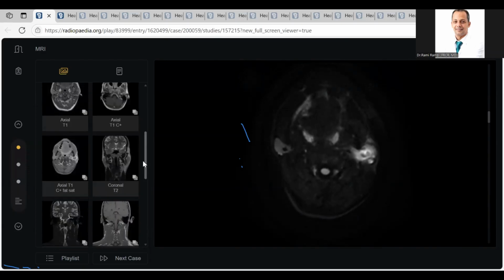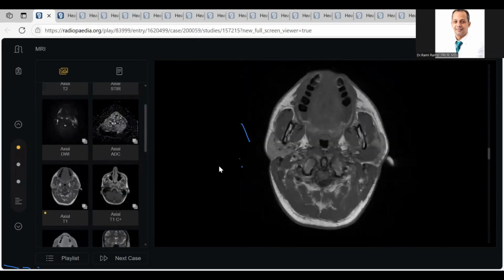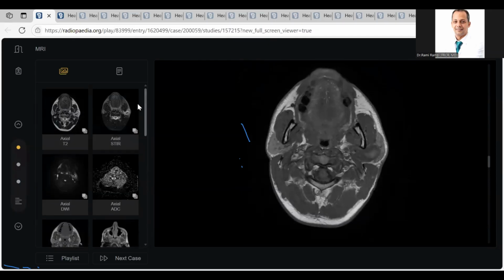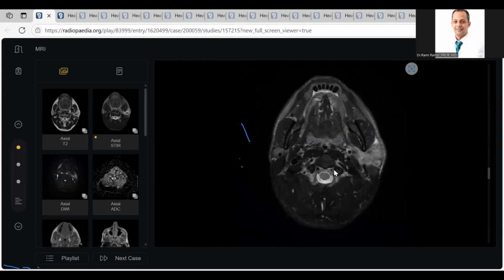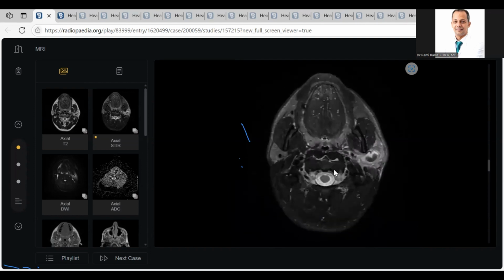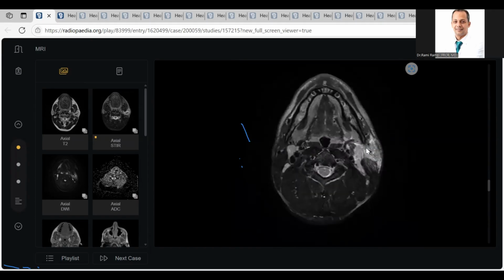In any infectious case, look at the surrounding fat plane, because sometimes the examiner wants to make it difficult. So what he will do, he will give you something like T1, T2. Okay, you see here some abnormality only, and in T2 or in STIR, this is the abnormality. If the lesion is ill-defined, an ill-defined signal abnormality, think more of an infectious disease. See here, there is signal abnormality affecting the parotid gland and the surrounding tissue. Oh, it may be tumor.